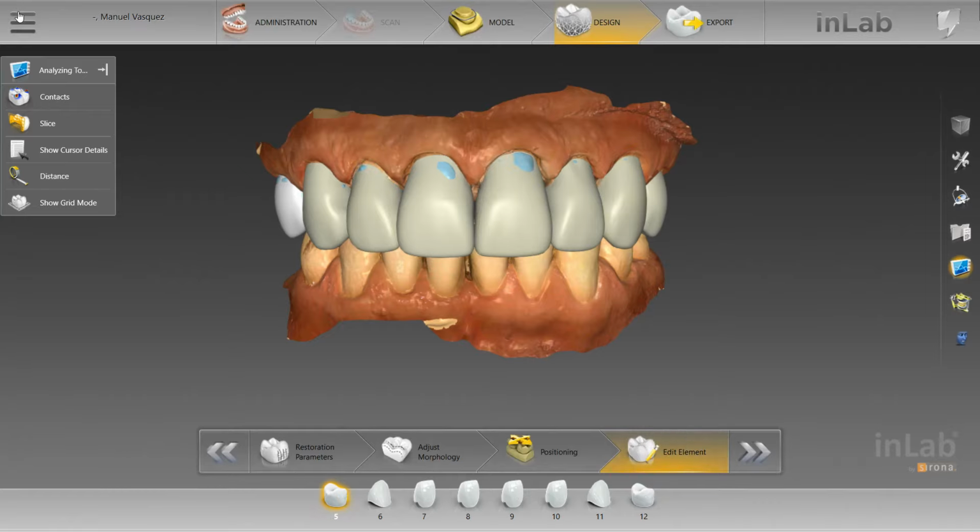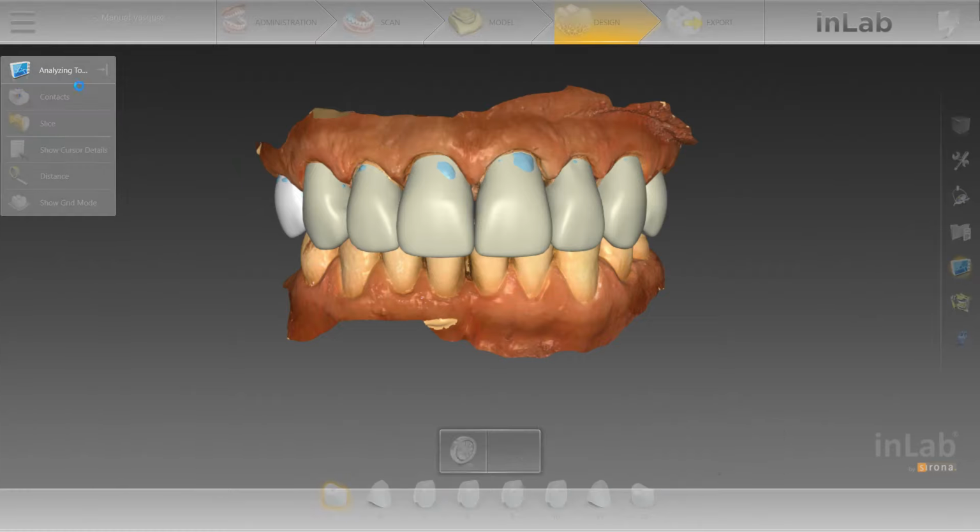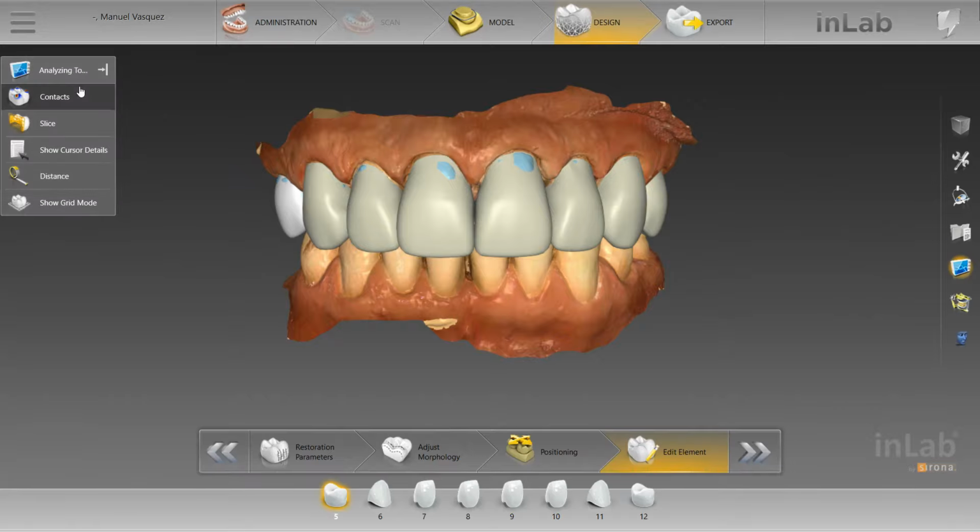All right, not bad. First things first, let's save it so we don't lose any of the work we've already done, if the software just so happens to crash. Now that we're here, this is my process. You guys can choose to use this process or not, but this is what's giving me the best results. I always start out with the laterals.